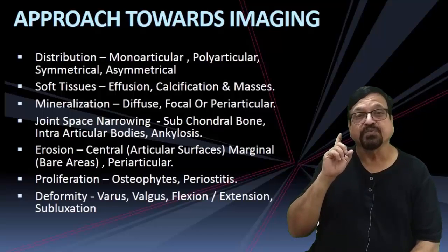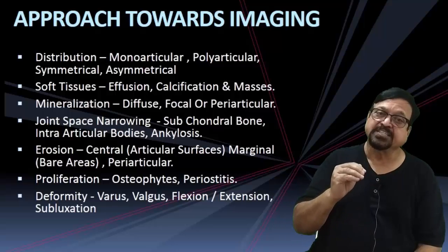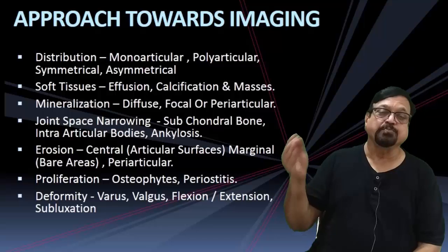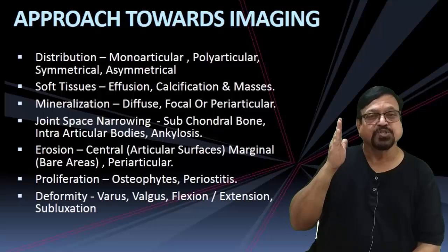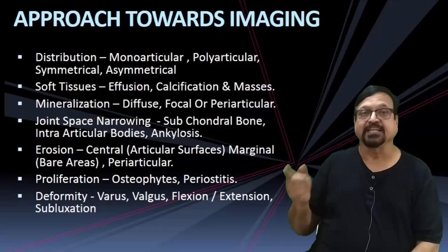Now, if osteophytes are coming, what does it indicate? The body is trying to support. Body is putting its effort to protect. If a painful joint is there, to reduce the movement. If the joint is unstable, to give the stability. So, the osteophytic role has to be understood and its presence needs to be interrogated.